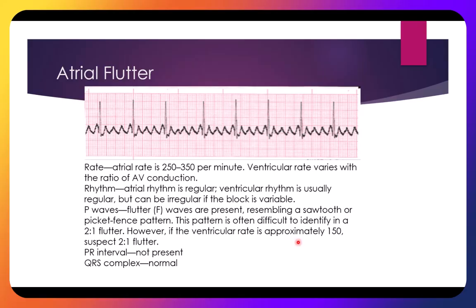Basically what you're looking at here are all of these fence-like impulses that are right along in here, okay? These kind of remind you of picket fence tops. Now, these are not P waves. Okay, these are not P waves. These are big F waves or flutter waves.